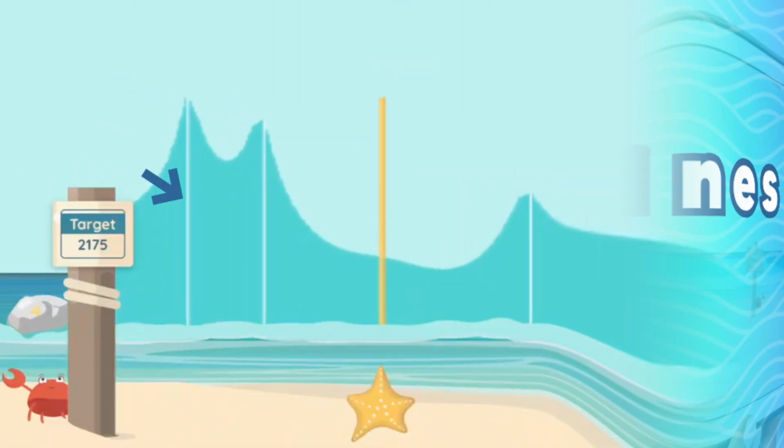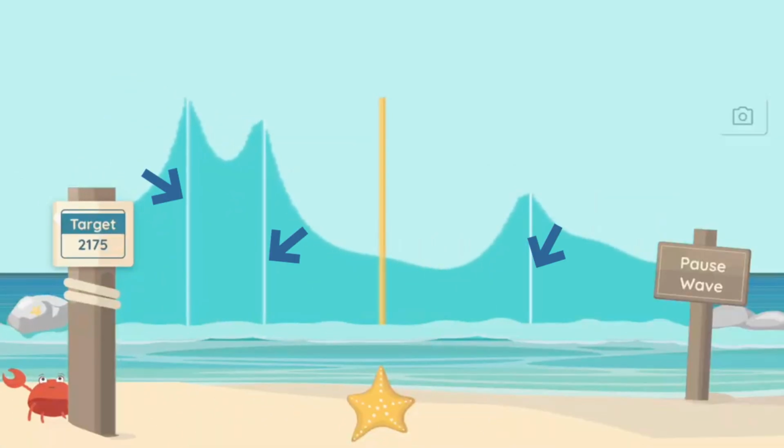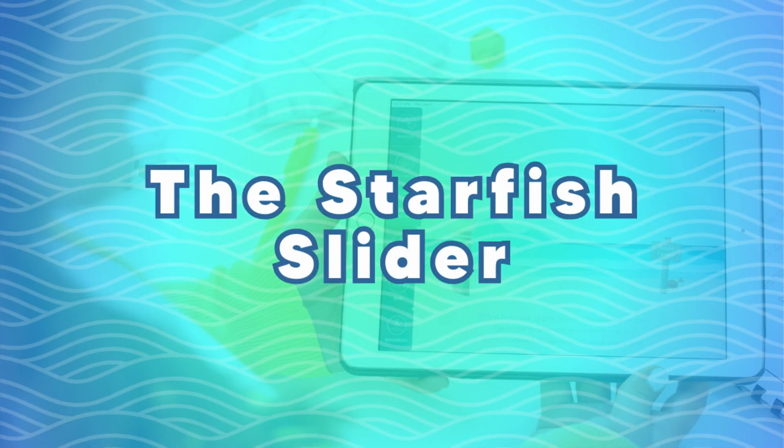Now, do you see these white lines on the screen? Those show you the highest point of each peak. Personally, I find them easier to spot than the tippy top of the wave most of the time. So if they're helpful for you, awesome. But if not, don't even worry about it.